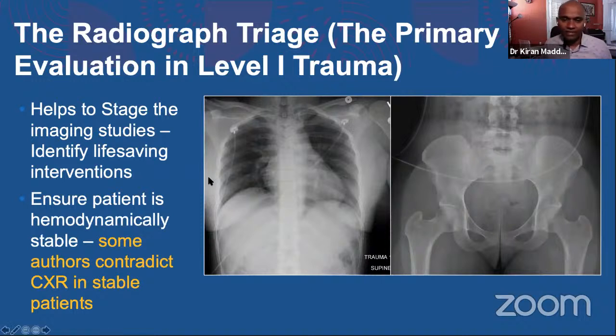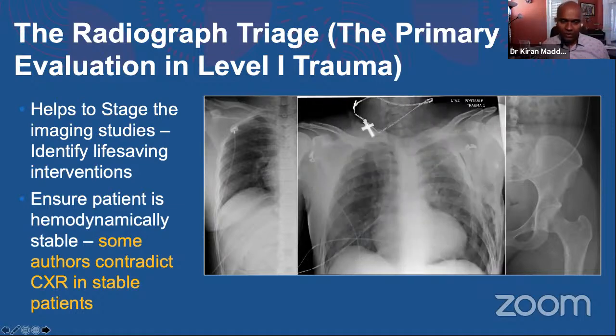And this is our basic primary evaluation in radiology. The patient will get a chest radiograph. And you can see here, again, instead of jumping onto looking at the images, see what is written there. It's written as trauma, supine. So this is a supine radiograph, trauma. For a trauma case, the moment this comes, my checklist pattern is different, and the way I look at it becomes different. And they also provide a pelvic radiograph to make sure how exactly this case is going.